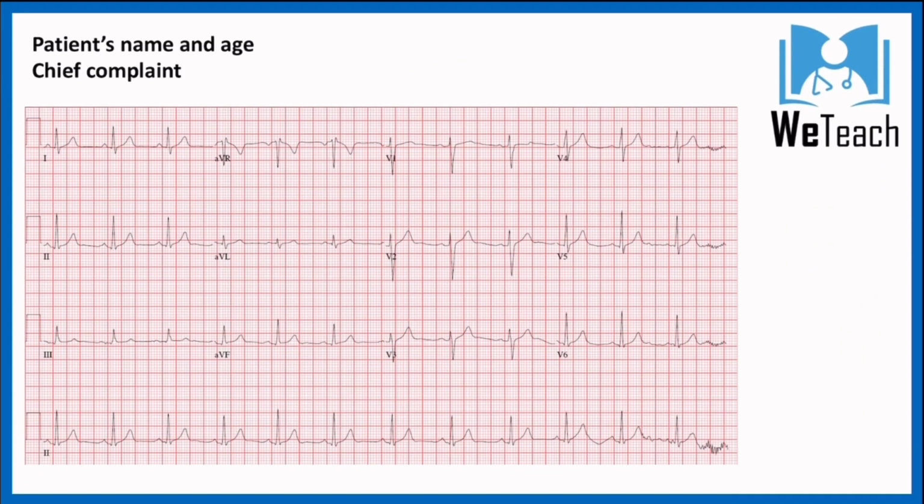So if you get this ECG, for example, the first thing I want to report is basically the patient's ID. So Mr. X is a 35-year-old male presented with chief complaint of chest pain.